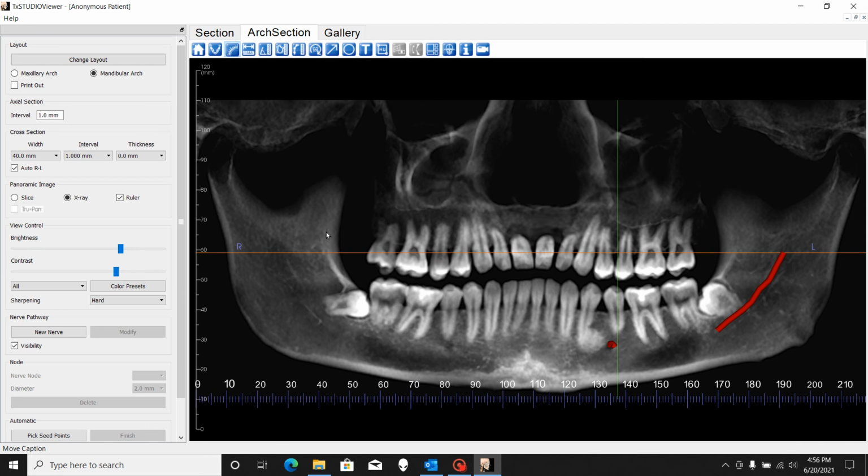So that's kind of the main areas of interest on this particular viewer.